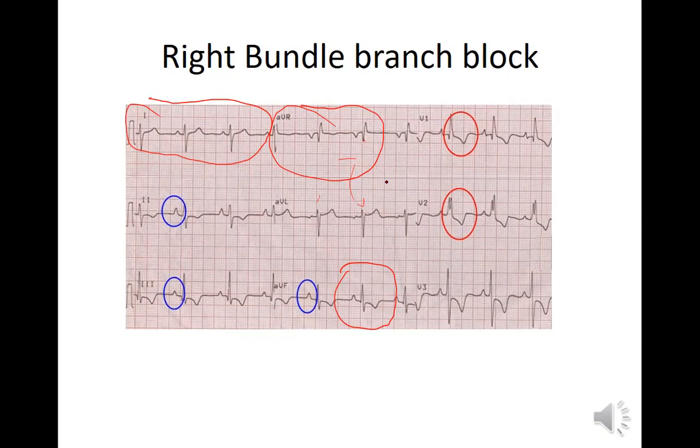So now let's look at rotation. V1, it only shows you the first 3 of the leads. So it's positive right off the bat. It's supposed to be negative, and this is the right side of the heart. So this is rightward rotation for sure.